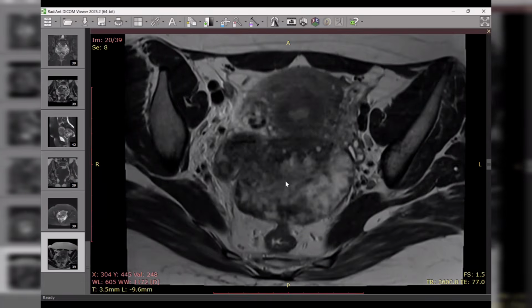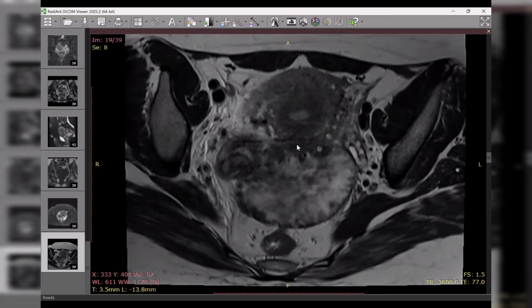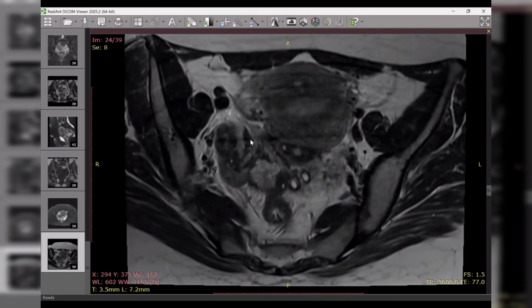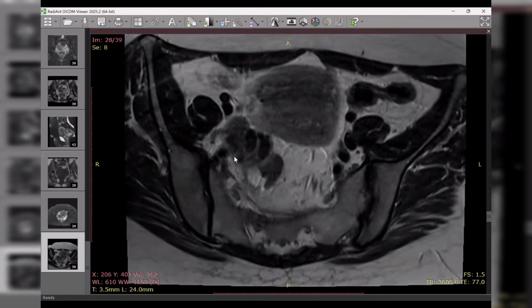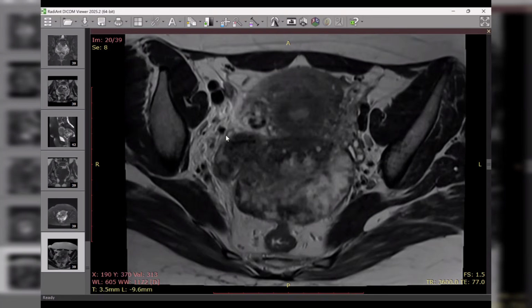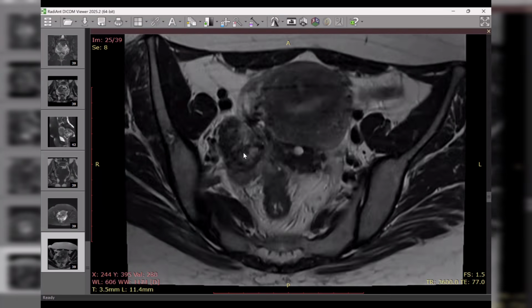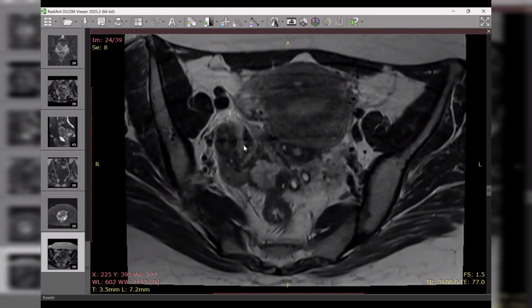Yes, I can hear you, but try to review my description for this case because we are running out of time. So what I'm stating here, as you said already, is acute right ovarian torsion. I put the case for this sign specifically, the twisted pedicle sign. As you can see here, these are the lobulated right ovarian vessels while twisted.